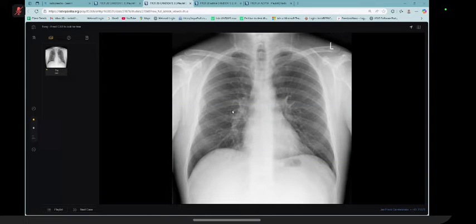Would you like to look at the right lung field very carefully, especially the peripheral areas? Yes, in the peripheral, I can see that there are bilateral, two well-defined pleural-based nodules related to the lateral aspect of the pleura. I couldn't see evidence of rib fracture or destruction of the ribs related to it.